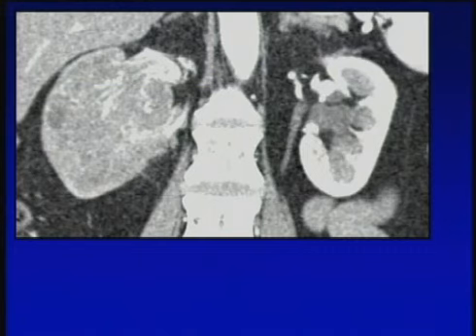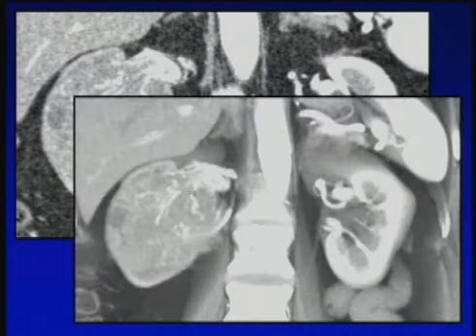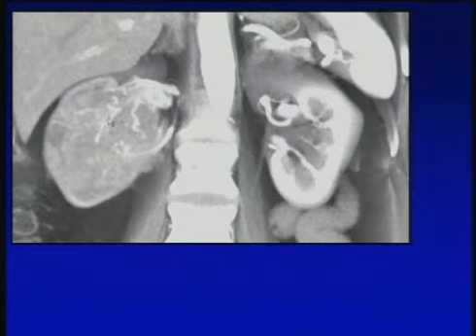Here's another example. This is a case literally we did about a week ago. Here's a coronal display. You see some of the vascularity. You see it here on a volume rendering. Here's a little bit better display showing you the neovascularity.